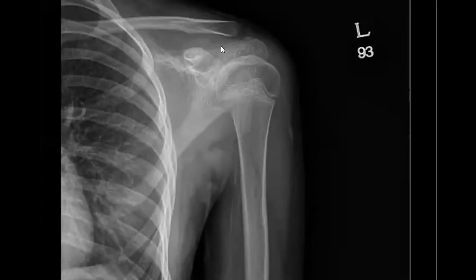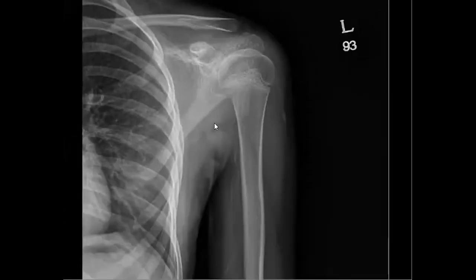They present you an X-ray like this and ask you to localize the lesion. This is in the long exam module. You have 3 modules: one is the MCQ, one is short questions, which are direct questions, and the last one is called core questions or long cases, which always start like this. They show you one image and say, localize the lesion.